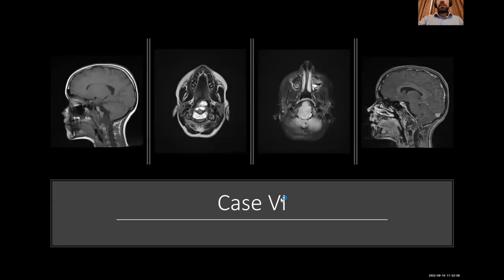Okay, next case. What's your impression? What else? Any answers?